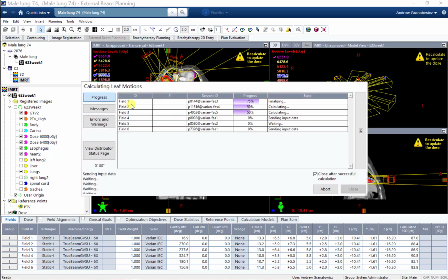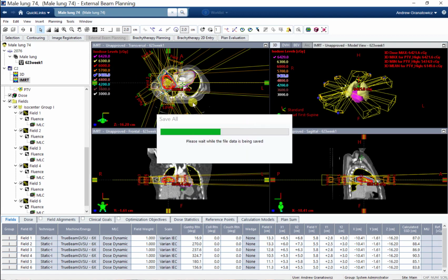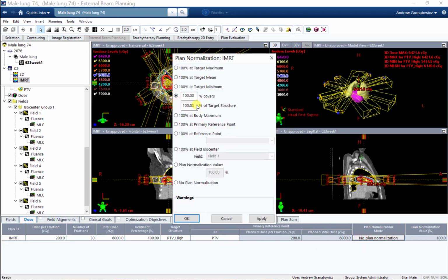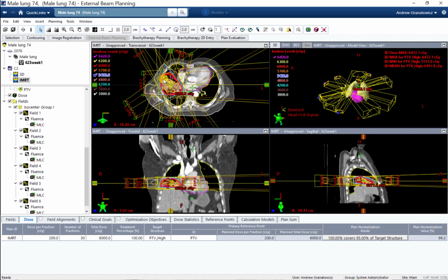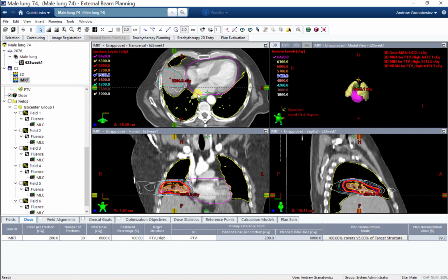Again, another benefit, this final dose calc for IMRT is very fast. Everything associated with IMRT, much, much quicker than VMAT. Normalize to our coverage, much, much better. So now our hotspot is somewhere 107.9. So a lot better. Our plan only had to normalize down 0.8%. That means those cold spots went away. If we look at our plan, looks pretty good.